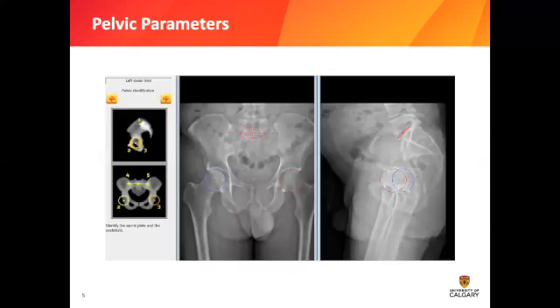So it starts us off with pelvic parameters, if that's what we selected. The nice thing is throughout this whole analysis, there'll be a little bar to the left, which will designate what steps you start with and what you're actually looking for within this stage. So for example, if we see 1, 2, 3 here, we know we're going to start the analysis in our lateral view, which will be with the first portion, the sacral plate, and then analyzing the femur head components here.